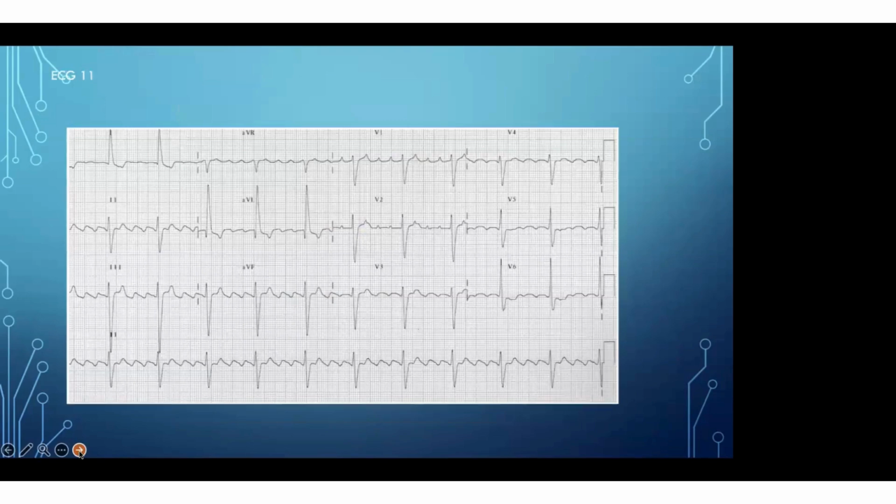Can you tell the diagnosis of this ECG? Is it a narrow QRS, or a wide QRS? What about the P waves: are there more P waves than QRS, or is P equal to QRS? What is the relation between P and QRS? Can anyone attempt the diagnosis?